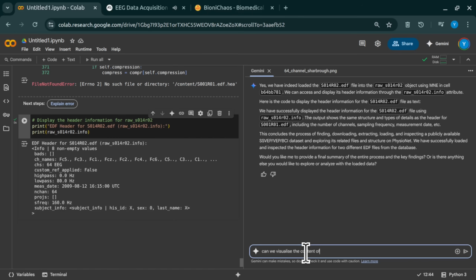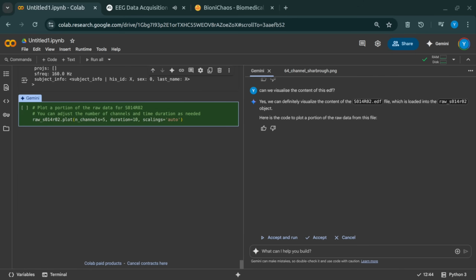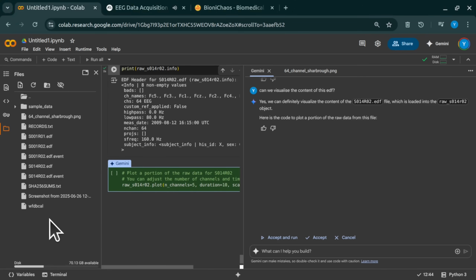Captures brain activity well without being, excessively huge data-wise. The header also confirmed the channel types were EEG, as expected. But interestingly, it noted that head sensor digitization wasn't available. And what does that mean? Practically no digitization. It means we don't have the precise 3D coordinates for where each electrode was placed on the head, right? Which, it limits certain types of analysis later on, like detailed source localization. It's a common thing with real-world data, actually. So right from the start, you get a sense of the data's shape and maybe its limitations. Exactly. That initial header info is foundational. It sets the stage for everything else.